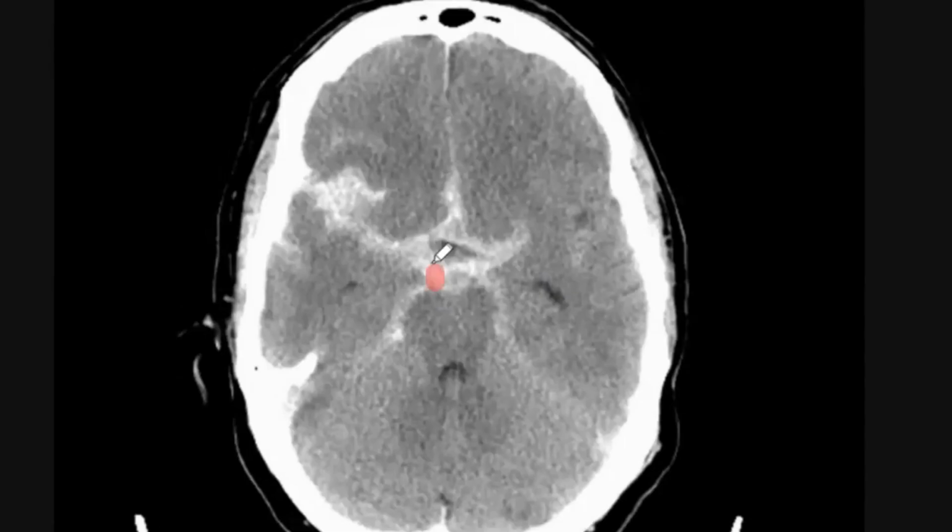But if you think about it, you've got your internal carotid coming up here, internal carotid on the other side. Your ACA starts there and comes up here. ACA comes up here. You've got your ACOM coming here. I'm having too much fun with this. And up the back, we're going to ignore this. That's your basilar. It divides down here. PCA, change the color, and you've got your PCOM, which connects this bit and this bit.